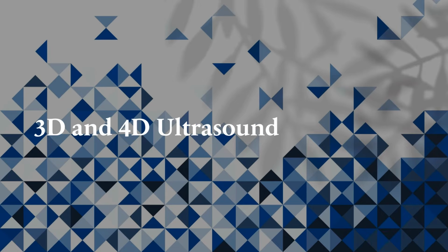Let's start with an overview of the fascinating topic we'll be exploring today. In this video we'll dive into the world of volume acquisition systems and how they enhance ultrasound imaging. From understanding the mechanics of 3D and 4D imaging to practical tips for obtaining the best sonograms, this guide is designed for both beginners and experienced practitioners.